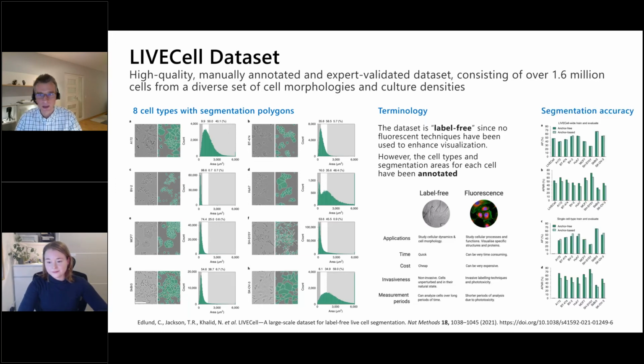And the authors of the data set, they also provide trained models for that and also benchmarks. What you can keep in mind is that they publish an accuracy around, for the overall data set, in terms of average precision, around, I think, 47, 48%. Yeah, and let's find out what we are able to achieve if we apply the same task based on leveraging automated machine learning for images. Harmke.